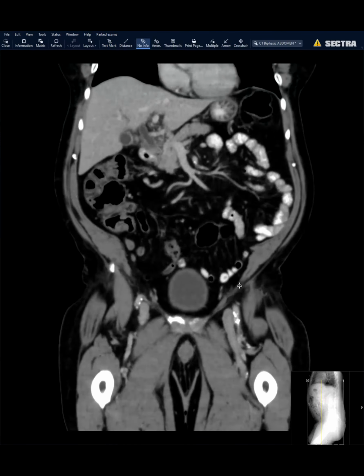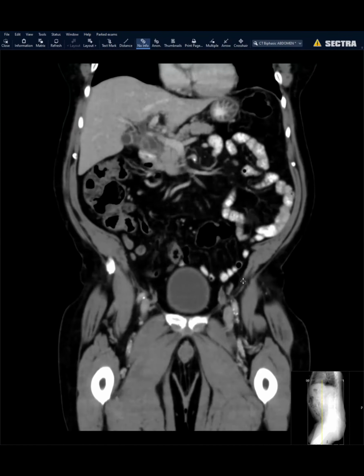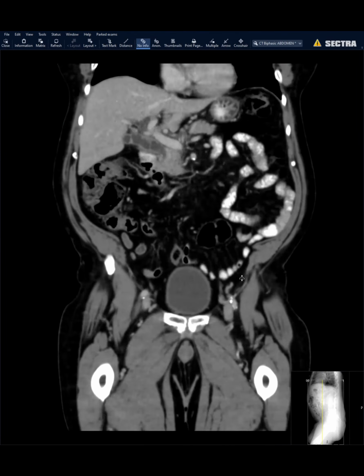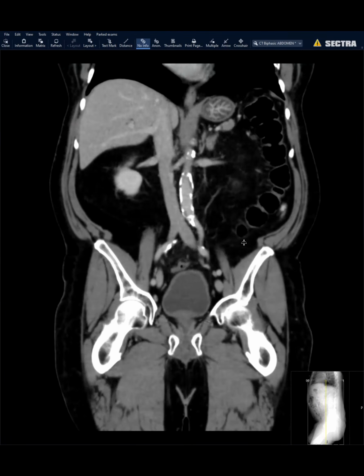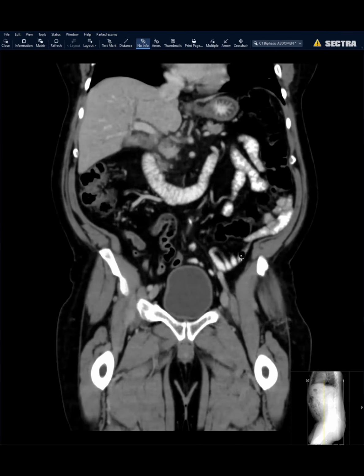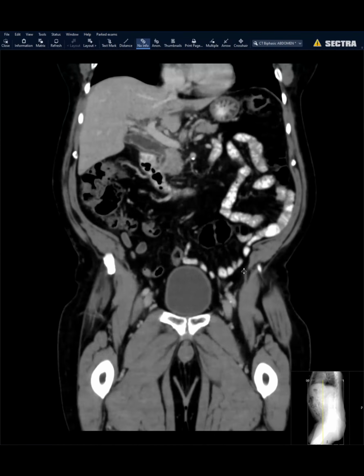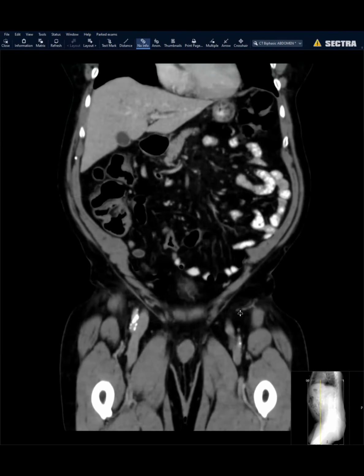To me, it looks unusual for a cholangiocarcinoma because I can see the bile duct going all the way through. But there is a transition there. Right. And there is enhancing soft tissue around that area, and some hyperdense contents. The cystic duct is also quite dilated, it looks like.